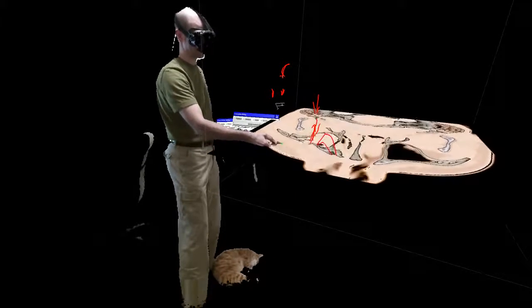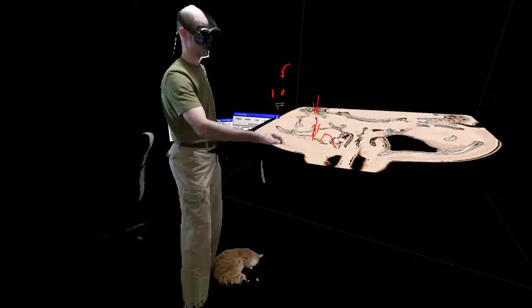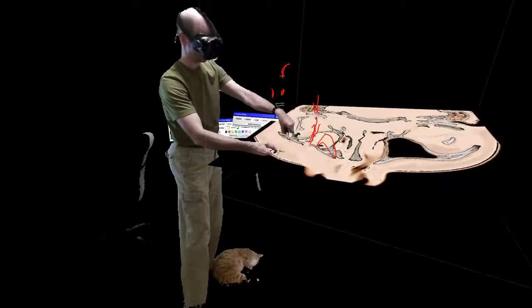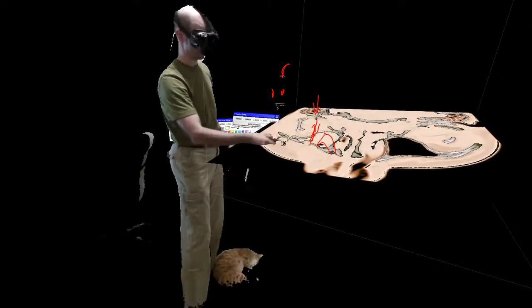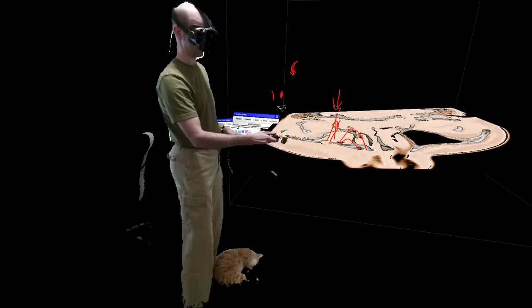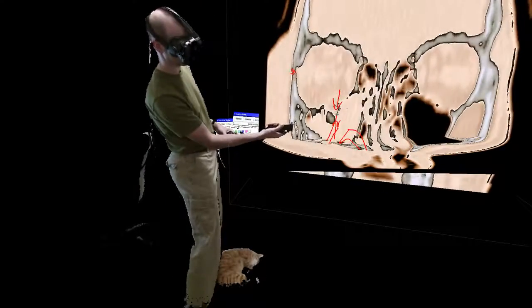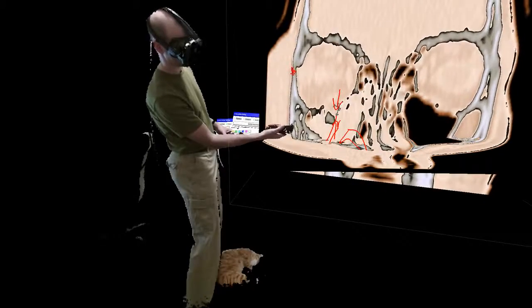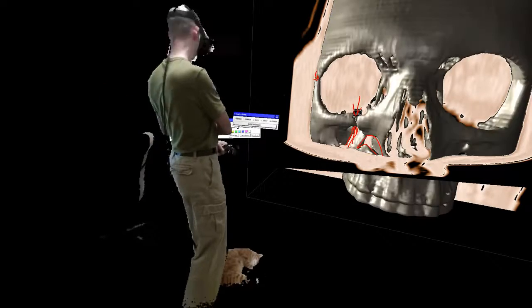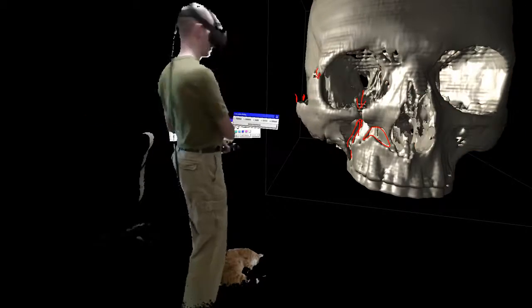And so if you drag a slice to, which is more or less a traditional way of how you would look at these kind of data, you can see what is going on. You can see that there's a fracture right here because there's a displacement between those two bones, but it's just a 2D cross section, so you can't really tell what the three-dimensional shape around that is unless you're really well trained in that. I can of course make another cross section like this at an angle, which might help a little bit, but still we're only looking at 2D planes, and so at least for me it is much easier to look at this as a surface where you can clearly see what's going on.